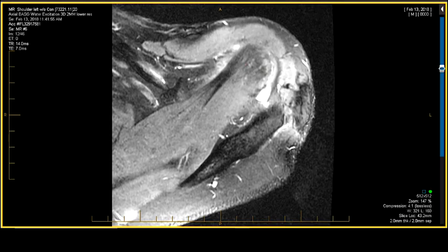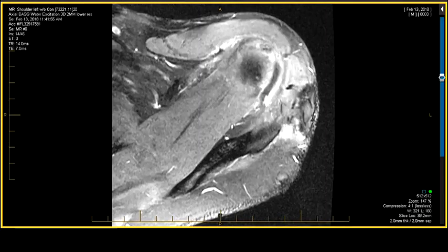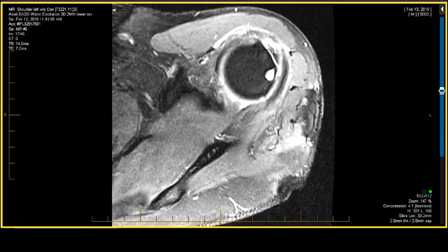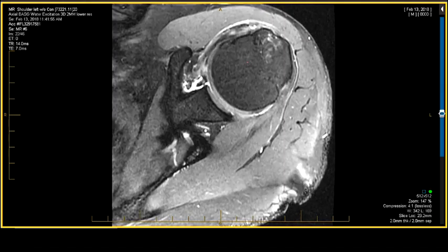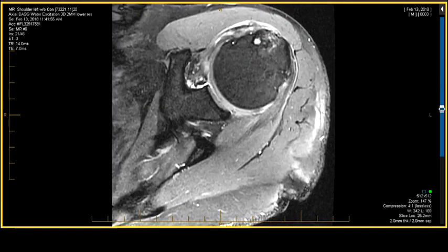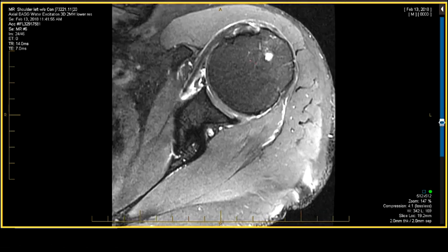In fact, it's not completely parallel. See, that fiber is not parallel to that fiber. And frequently, the infraspinatus fibers will curl and come underneath the supraspinatus fibers, so they will overlap. There is some bursal fluid posteriorly. I'm working my way down, looking at the character of the humeral head. Is there a Hill-Sachs? No. Is there an impingement-type pseudocyst? There are innumerable ones. So the patient's probably an impinger. There's some in the front, external impingement. There's some in the back, internal impingement. This convention was generated by the French. That's why it makes no sense.